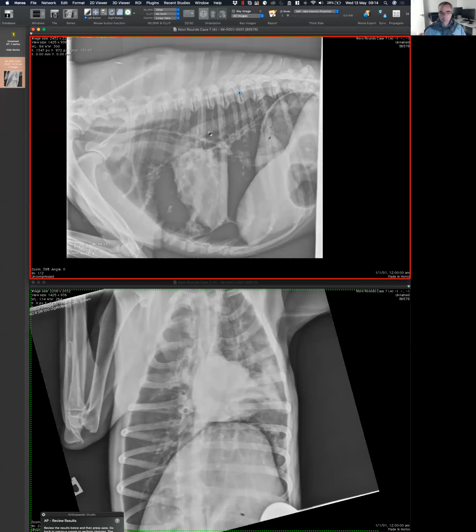Okay, so I'm not sure that I can annotate it. It's not bringing up the... Okay, that's okay. But if you need to decide, I give you options: right, left, middle, cranial, or caudal. What I'm calling the bronchial pattern is most marked in the VD, on the left on the view of the heart.